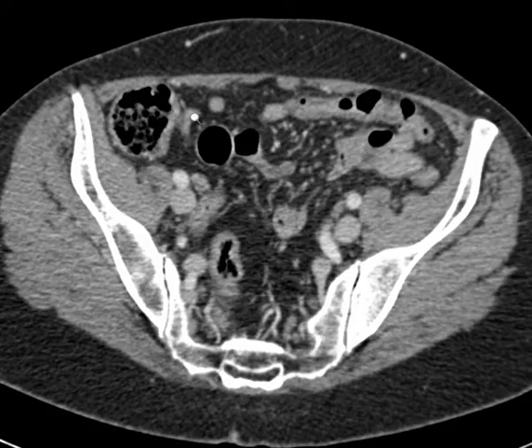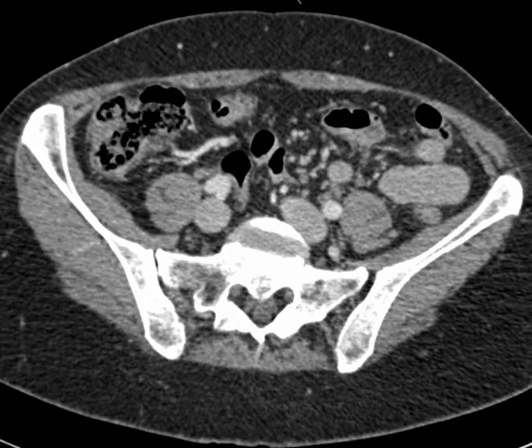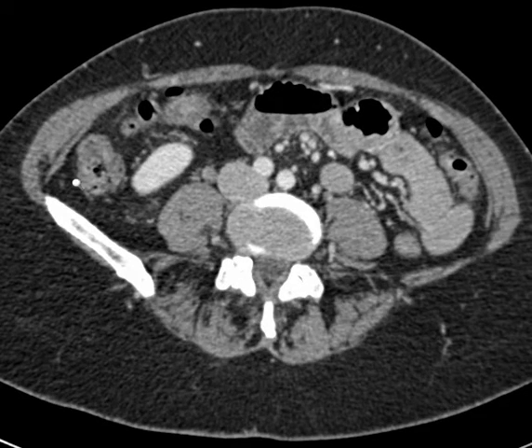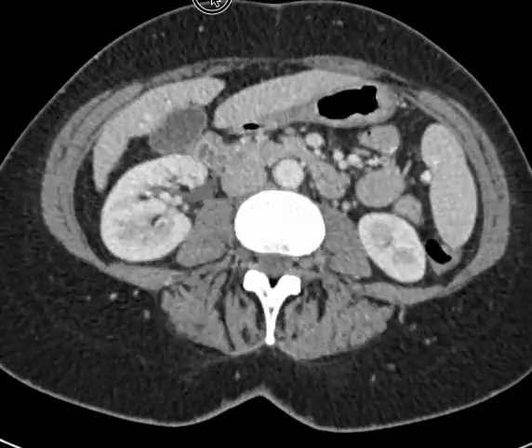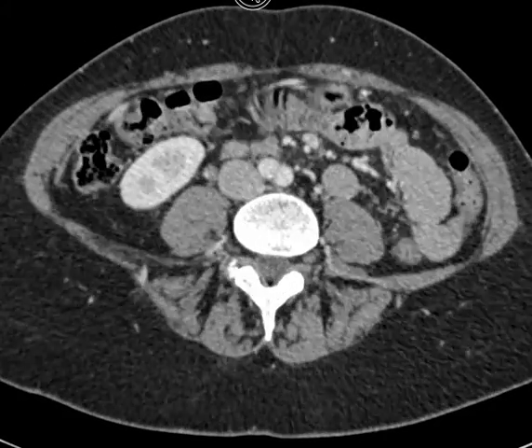Okay, again, here's that ileal loop. And then as we come into the cecum here, and now we head back up towards the head of the patient, we're going to be following the ascending colon. Okay, so here's ascending colon, just to scroll back and forth. You can see that. For reference, this is the right kidney. And now we'll see this is the hepatic flexure of the colon. And the reason we say that is that the liver is right here. So watch as it's scrolled. So there's liver. And then we see the hepatic flexure, and this is getting into the transverse colon.